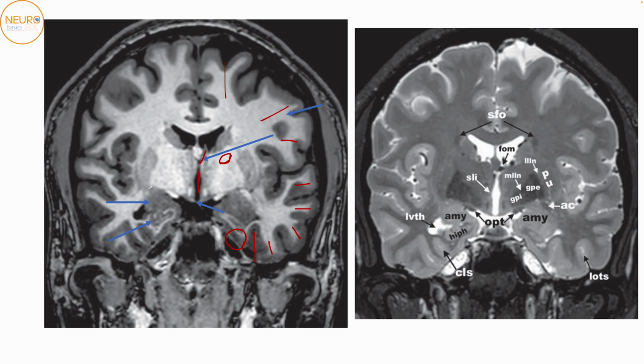Okay, so apart from that, now we're able to see there is some grey matter located along the floor of the temporal horn. So this here is your hippocampus. You can make it out here also. This folded structure over here is the hippocampus. This is the amygdala and this is the hippocampus, this folded structure here. This here is the optic tracts, and this would be the hypothalamus over here.